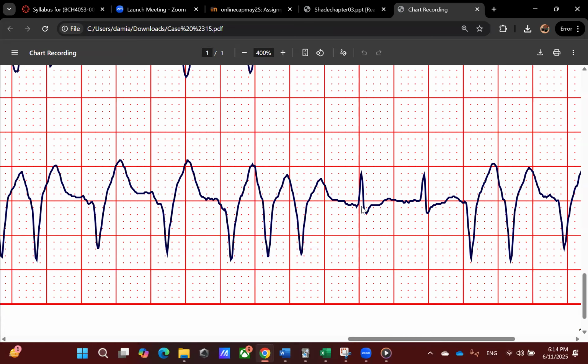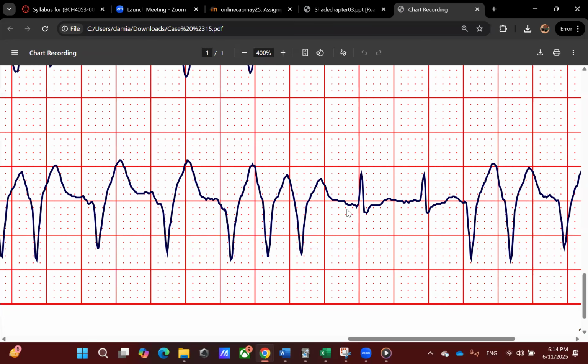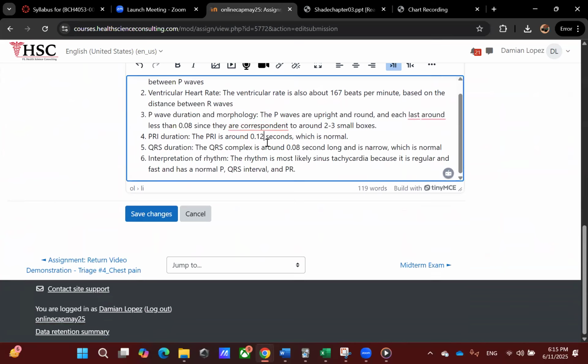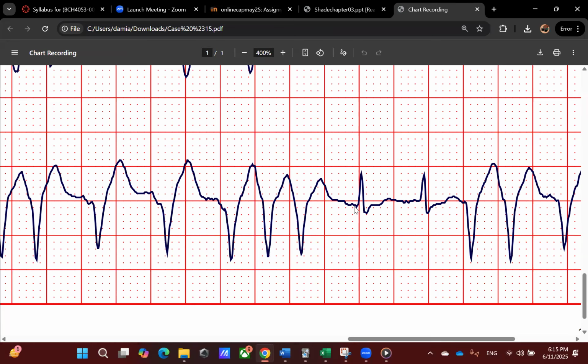So it goes from P to R. Now, same thing, going from this whole complex from here to here, I would calculate it to be, actually, it's definitely more around 3. I can take a good look at it. Now this should be around normal, so the conclusion is still the same, and we should be fine.